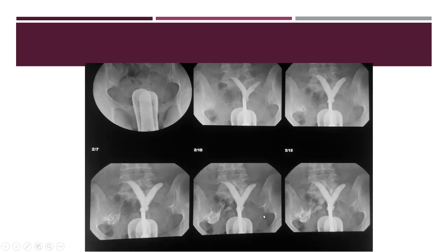But again, better to look by ultrasound. So this is a subseptate uterus. The fallopian tubes are normal, but this is a subseptate uterus. In the subseptate, usually it may not be the cause of infertility, because usually the baby will take its normal position, transverse position, bypassing this septum, except if abortion occurs or something like that.